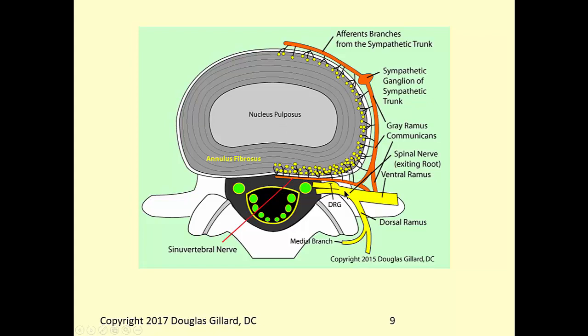It's crucial that you understand this. You'll fail the class if you don't understand this, because pathology deals with compressing these different roots. And these are the S1 traversing nerve roots. Traversing, meaning they're going to go down a little bit. They're going to turn the corner and look just like this, down lower. Okay, so if these are S1, who are these? These are S2, S3, S4, S5.